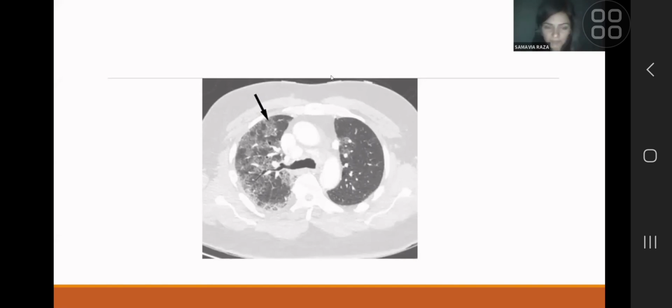Next one is this one. If you just tell me what this part where my mouse is showing you. So 30 seconds once again, please. Can you put the mouse again, please? Yeah. 10 seconds.